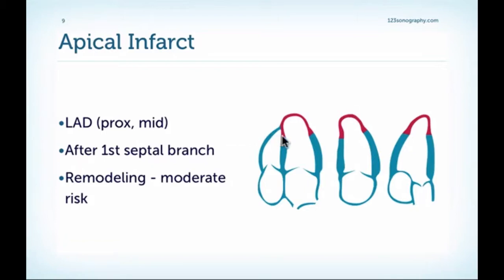If you look at the regional wall motion abnormalities in these patients, you can see that the infarct involves the distal septum, distal lateral, often infraapical, and the anterior septum in here, and even the distal lateral or posterolateral region. So more segments are involved.